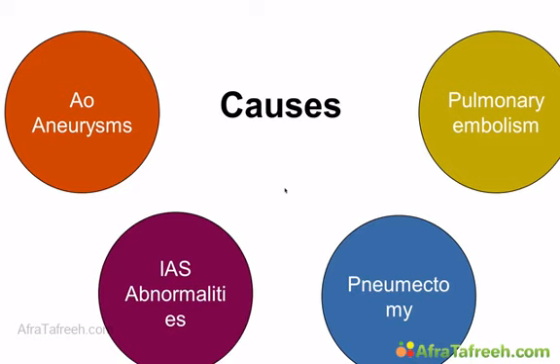How do we treat the patient? Well, the patient obviously needed operation for the aortic aneurysm anyway, and he underwent operation. In addition, the interatrial septum was closed, it was sutured closed, and the patient improved dramatically, and he is doing very fine. He has no symptoms, and he has a very good exercise capacity.